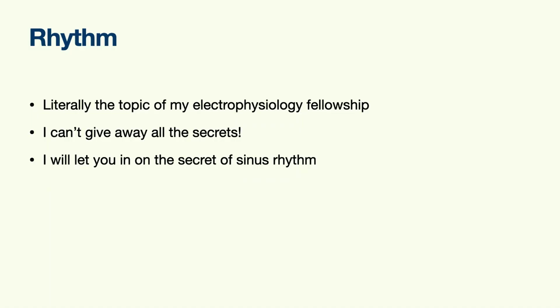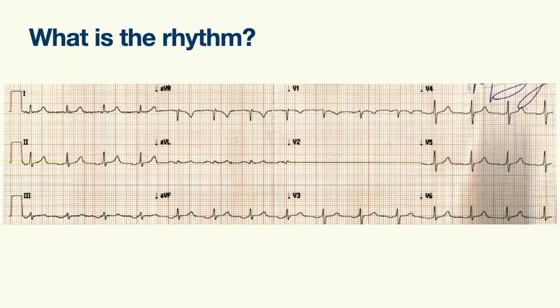You're all going to leave the room, and I want all of you to be able to identify sinus rhythm on ECG. So I'll give you a sample ECG, and I want you to tell me what is the rhythm. And I'll let you look at it for a little bit. I'll give you a little hint.